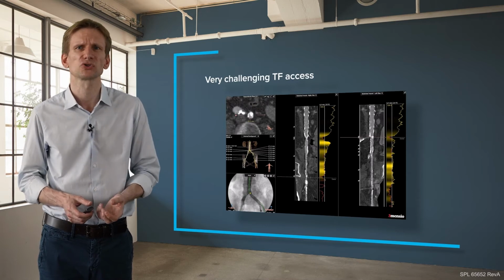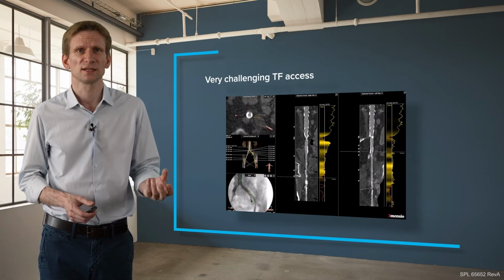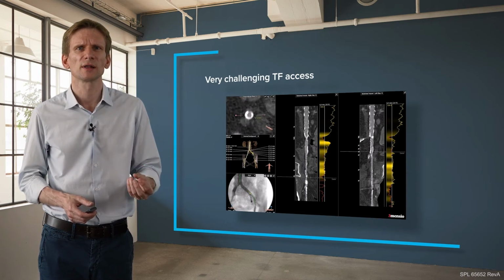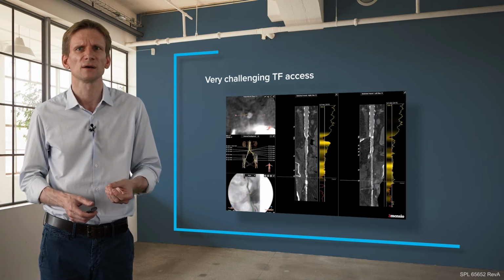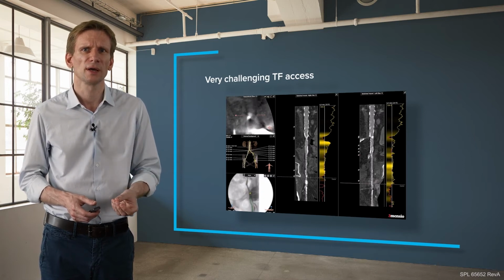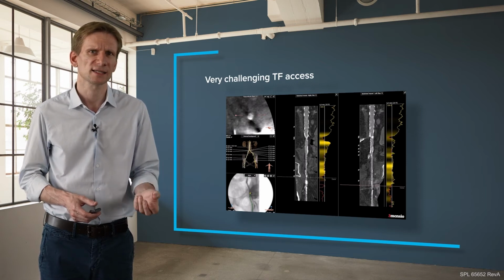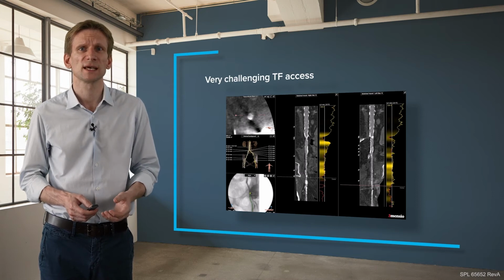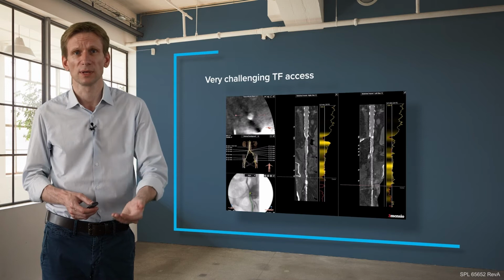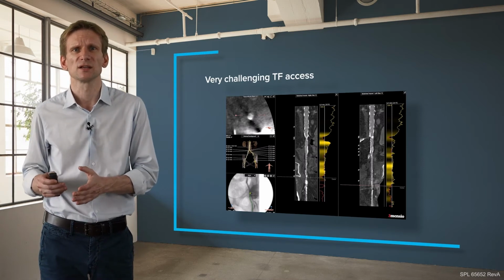So that's why we also analyze here the left side of this patient. You see 360-degree calcifications, luminal diameters which go really small, up to 4.5 millimeter. But further on the external iliac looks okay. Also the access site I assess as being favorable for transfemoral TAVI. So with this case, we proceeded and we planned this patient for IVL-assisted transfemoral TAVI.